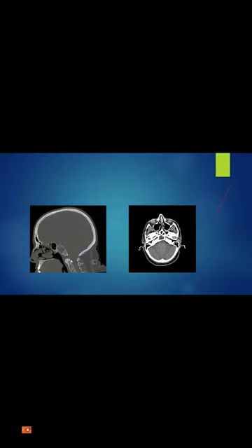So it's an expansile lesion. As you said, the cortex is good. And this is usually fibrous dysplasia of the clivus. It's a leave me alone lesion that, if you have an MRI, might be scary because it looks scary on the MRI.